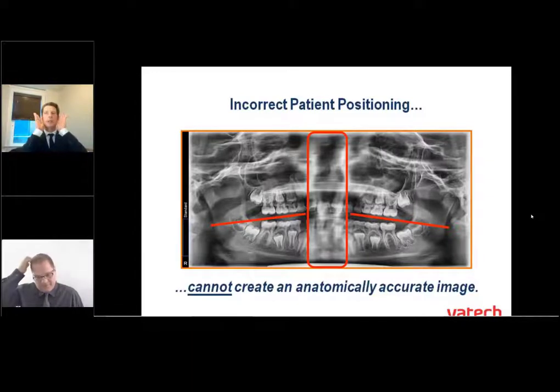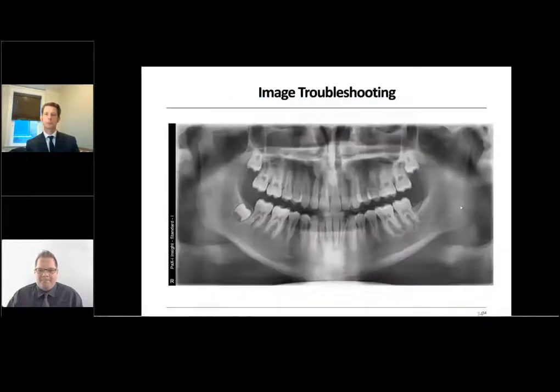If you tip the head down, it's going to bring the condyles straight up and down there. Right. Yeah. If you see the head was tilted a little bit more, you probably would have cut the condyles right off there. Right, out of the picture, yeah. What about this one? This is kind of the exact opposite of what we just saw.